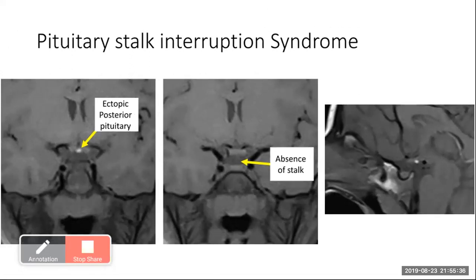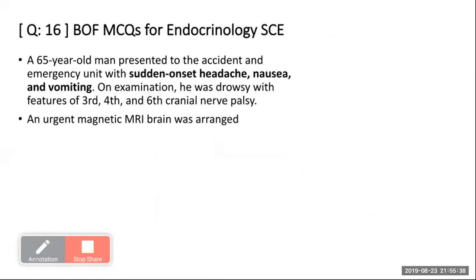Okay. In the coming slides, I will give some questions from Dr. Khaled Banks. First, we talk about this question. The imaging of the pituitary in the exam is either a helpful image accompanying the question, or it is the core of the question about the diagnosis from the image.